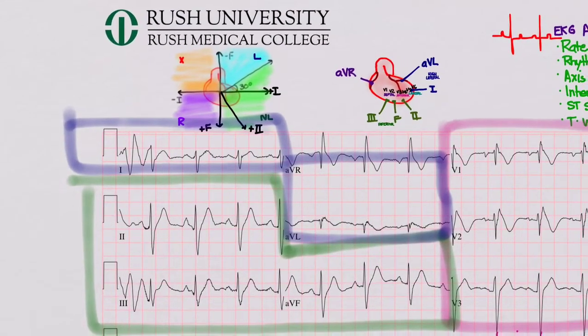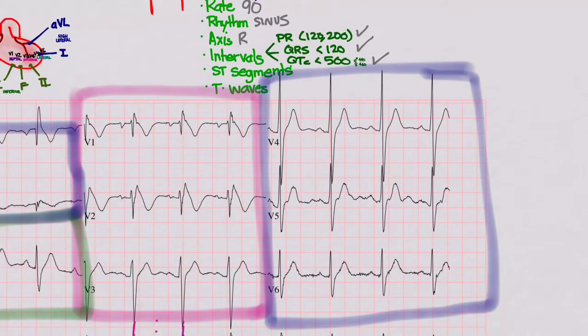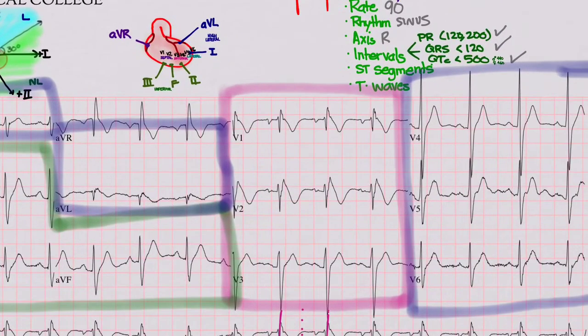First, let's look at our lateral leads, and these look like the ST segments are good. T waves are up. ST segments are down here, right? T waves are down. ST segments look, I don't know, it's hard to say. Okay, let's look at the other lateral leads. T waves are all up, and the ST segments are about flat. Okay, let's look inferiorly. Inferiorly, we got T waves all up, and ST segments, despite the wavy background, look okay.